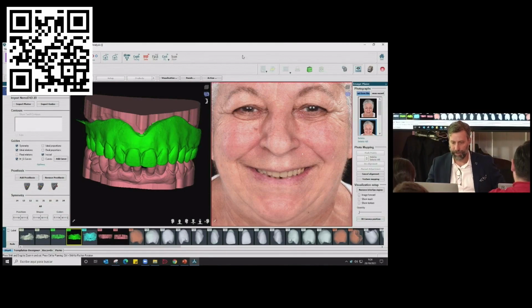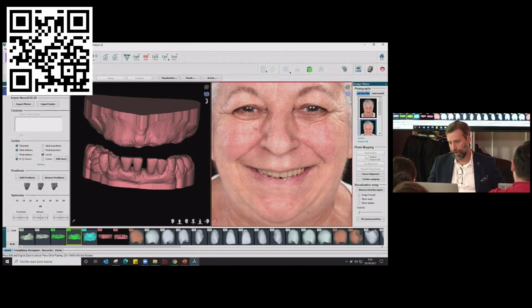If we don't have the denture, the patient will not show the ridge on the picture, and we cannot overlap things. And even the CBCT, many times it's hard to overlap the ridge on the CBCT. So we strongly recommend to always use the denture as the linking part of the different pieces that we need to plan, right? The pictures, the STL, of course, and the CBCT, okay?